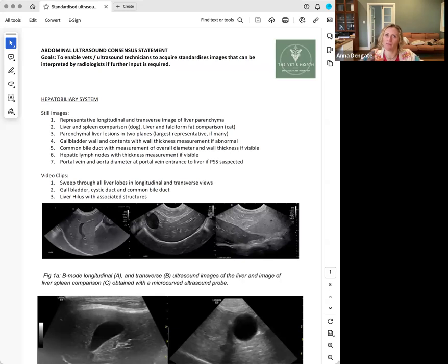And that's really important because that might be a mass lesion that's not showing up as a discrete round mass lesion, or it could be an infarct or a process that's only affecting one lobe. So generalized or focal, and then all of those things.